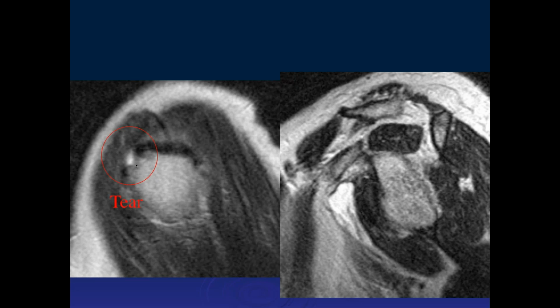Well, I would just like to follow the tendon maybe in the sagittal planes, do other images, make sure. This is a sagittal plane. That's really all you see. You can certainly look at the coronal plane. Coronal, there's something else here that highly correlates with this being a full thickness tear. What else do we have here? There's fluid in the subcoracoid bursa. Right. So here's fluid in the subcoracoid bursa.